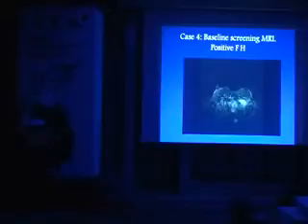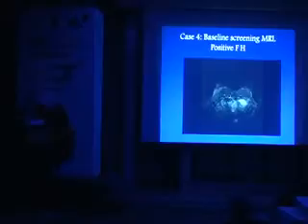So, patient coming for routine screening MRI, she has a positive family history. Did you notice anything? Yes? Okay, I repeat it again. Show it to you again. Look at the left breast and compare it with the right breast. Always do this.